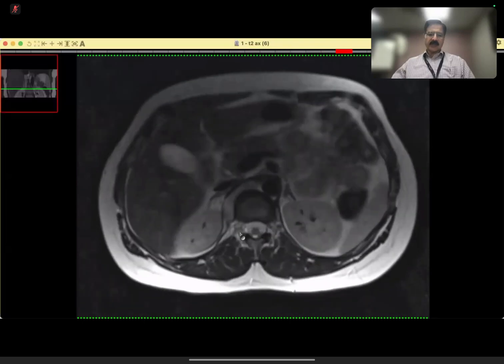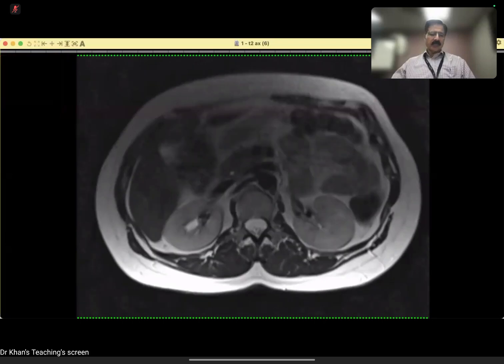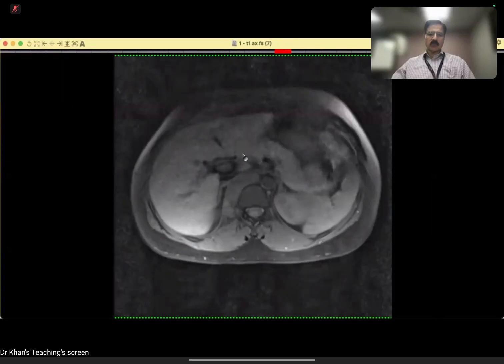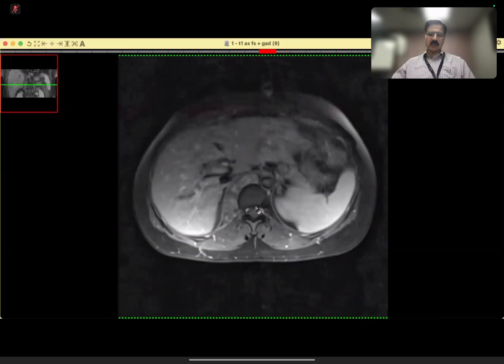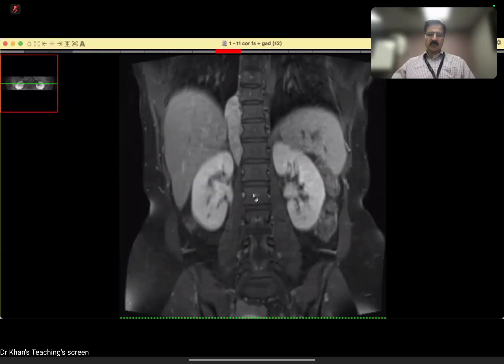So these can arise from the sympathetic chain. And then on post contrast, this is pre contrast, fat saturated, and on post contrast, there you can see that there is some enhancement. It's not cystic. It was low density, but not cystic. And on post contrast, this is it. So it is a classical neurogenic tumor, but was a classical observation film. Well picked up by the candidate.